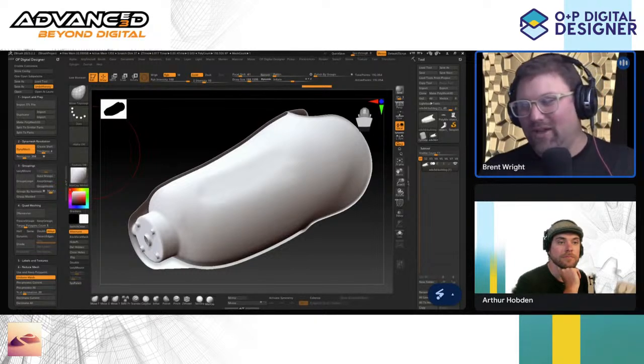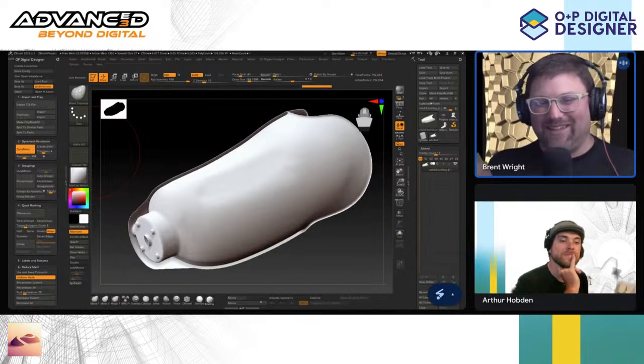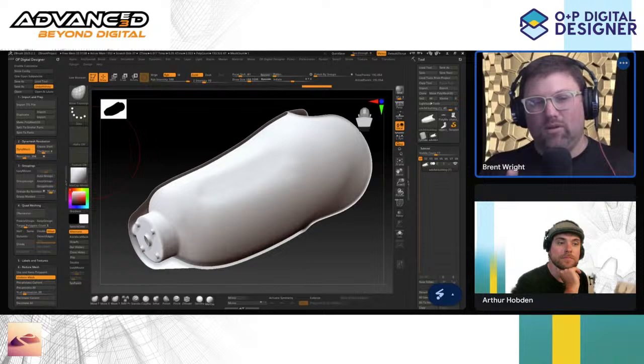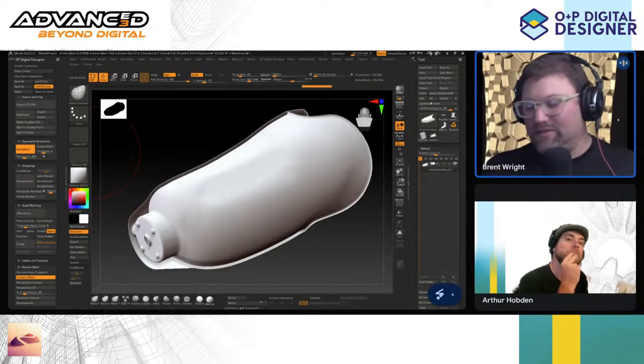I grabbed the interface and I finished the device. But it's like, I don't understand why more people or more companies won't give the clinicians that ability to get their mesh out and choose how they design the device.